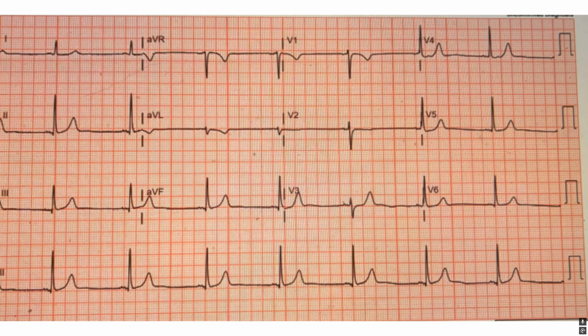Here's the first EKG that they have. Let's go through it, okay? Good thing she works at a real hospital with real rhythm strips here in lead 2. I do see 1 P for every QRS, kind of a short PR interval, but looks sinus to me. Rate looks relatively bradyish to normal. The axis, up in aVF, up in 1, so normal.